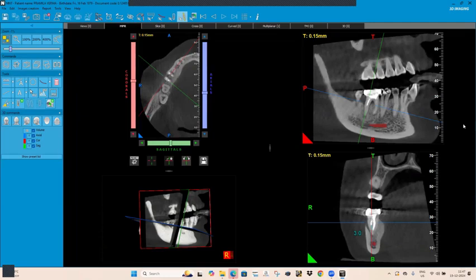Can we follow the same thing we are doing for the maxillary sinus, the way we calculate the volume for the sinus as well as the airway spaces? Will it be possible to apply it to calculate the volume for the pulp chamber and pulp canal?